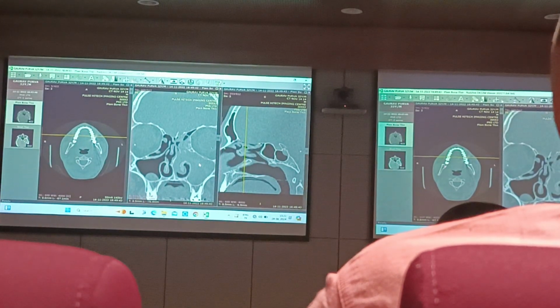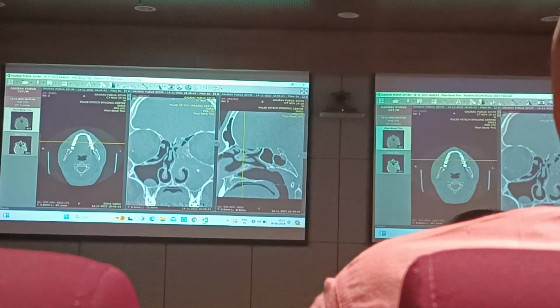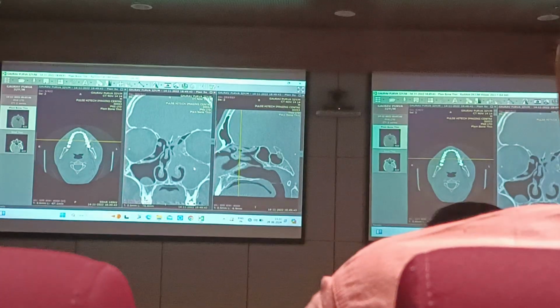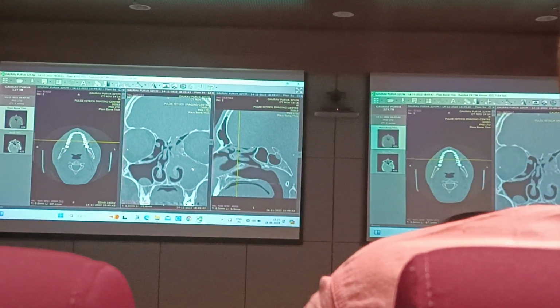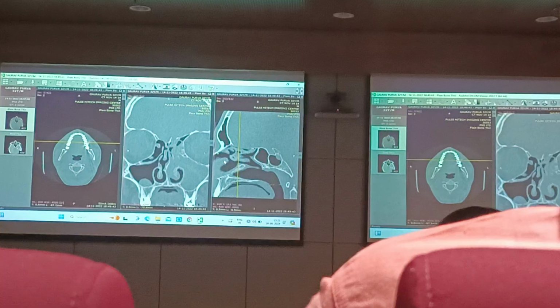So I've been propagating this for the last 2-3 years because of so many problems. We get a lot of patients referred to us. Someone has gone into the sphenoid for biopsy and you have a huge CSF leak because the meningocele is coming down straight there. Someone does something thinking it's a fungus and they get something else. So we have had patients coming to us like this. So better to investigate and then think of what we really want to do. So this is how we study the scans on 3 planes. Is this clear to everyone?